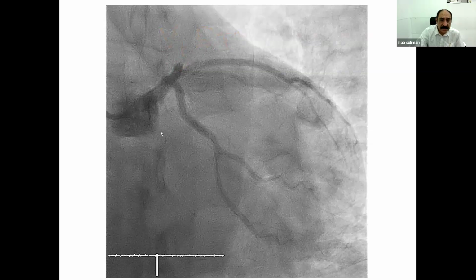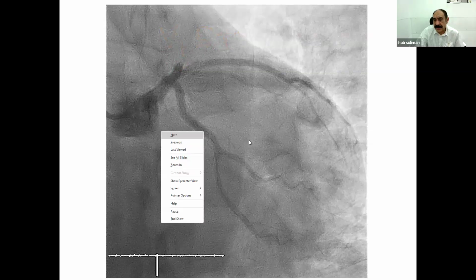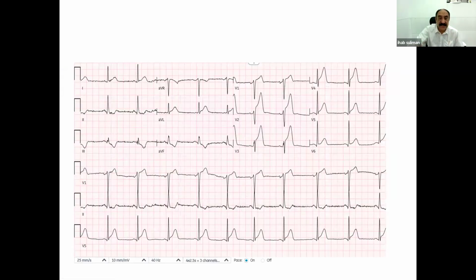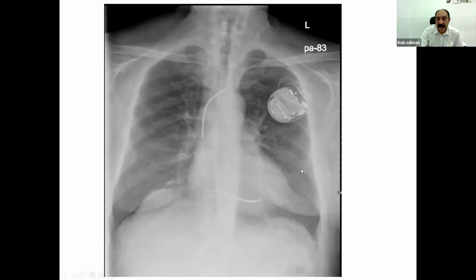So let us take another example. This is almost a normal ECG, but I take you to another example of another ECG ST elevation scenario, and we can show you the ST elevation here for a patient who had an anterior STEMI, an inferior ST depression, which will make an MI likely. So again, this patient received an AICD.